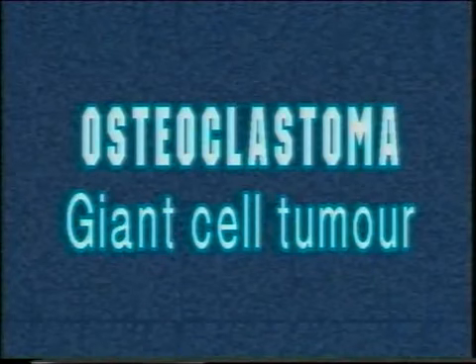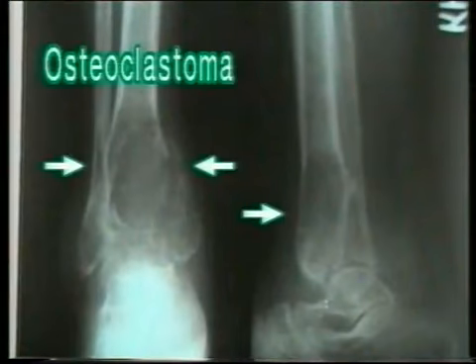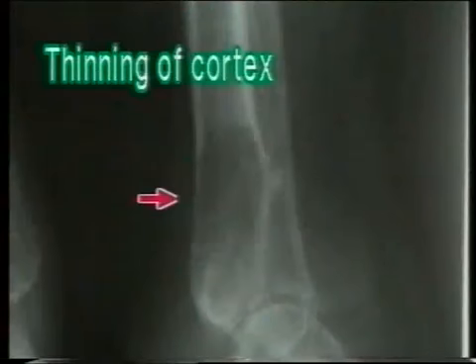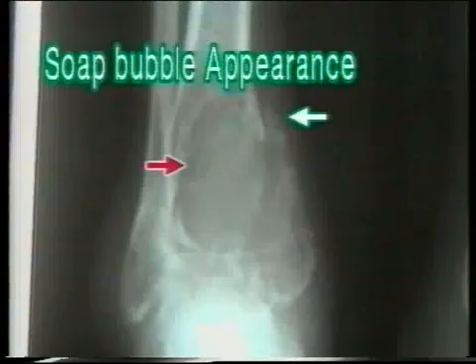Osteoclastoma or giant cell tumor. This is an X-ray of the lower end of tibia. Note the radiolucent expansion of the bone with the thinning of the cortex. The red arrow points to the thinned out cortex. There is no periosteal elevation or periosteal reaction and no extension into the soft tissues.